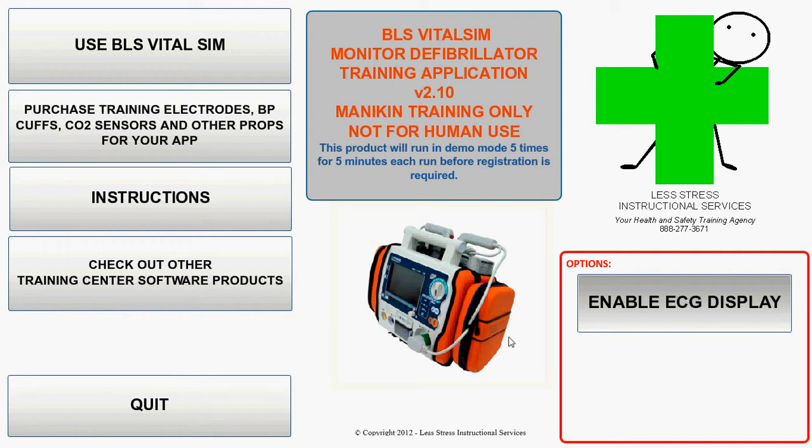So I'm going to walk you through this particular process very quickly in a matter of a couple of minutes. The main menu is displaying now, and I just wanted to show you the ECG display. So if you depress this, ECGs will display on the screen, and if you do not depress it, the ECGs will not display on the screen. So basically this allows you to contour the monitor to whatever your jurisdiction allows EMTs to do. So if they don't do heart monitoring, then you turn it off. If they do heart monitoring, you can leave it on.